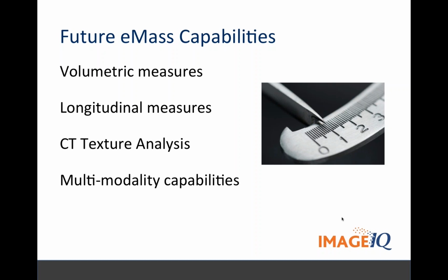And then some of the other criteria require additional modalities like PET, for example. So eMass in the next release will have the ability to import PET scans, and then you can co-register them automatically to your target modality.